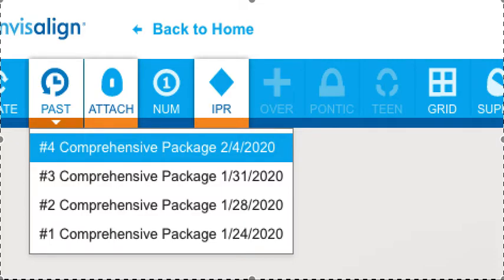So again, back to our 35-year-old patient. Couple options: expansion and proclination, IPR, or somewhere in the middle. So what I always do is recommend coming up with those various treatment plans. And I can do these.